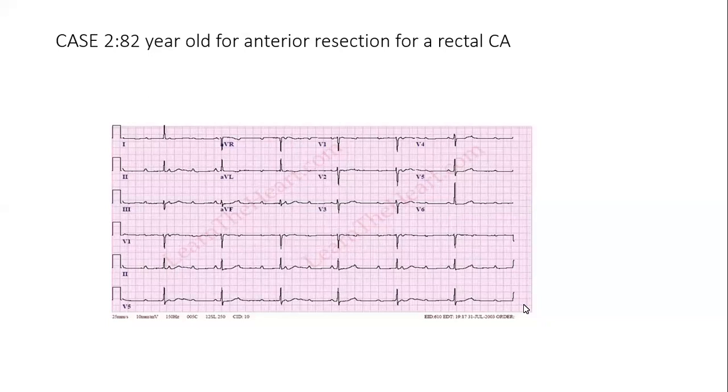Is there correlation between the P wave and the QRS? Look at it again. So take a V2.